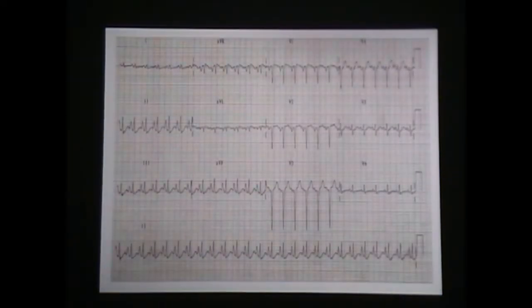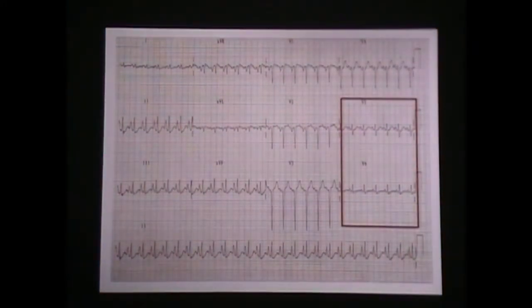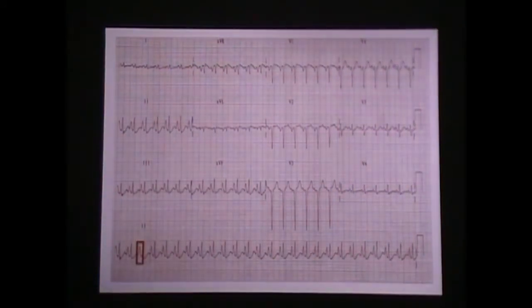So when we look at this one, look at lead 2, the P waves. Those things are smoking peaks. Okay. Look at the dampening of your QRS complex over there. So that's a nice clinical picture of COPD. And then you can see, let's find a nice isoelectric line. So you can see that sagging right there. And it's hard to do with an ST segment, the sagging, but you definitely can see it in your PR.